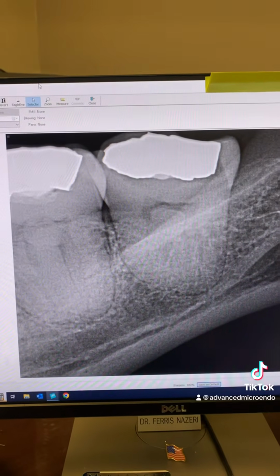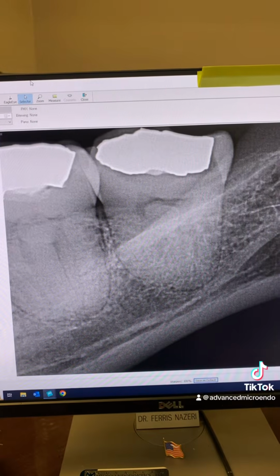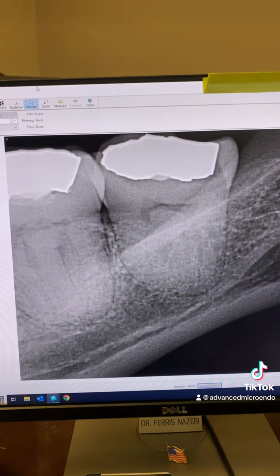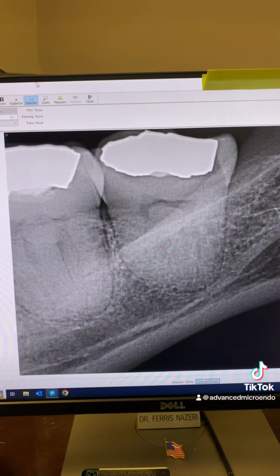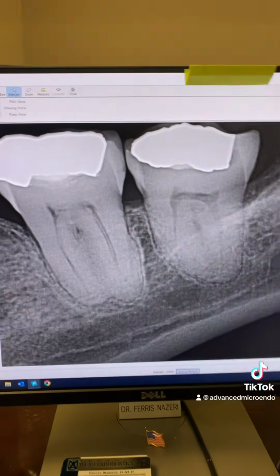I mean, it could be an acute apical abscess, but very likely not. If the patient has a facial swelling, very likely there is a periapical radiolucency. So you need to look for that. Very rarely you find a facial swelling with no periapical radiolucency, and that's called an acute apical abscess. Okay, let's look at another angulation PA.